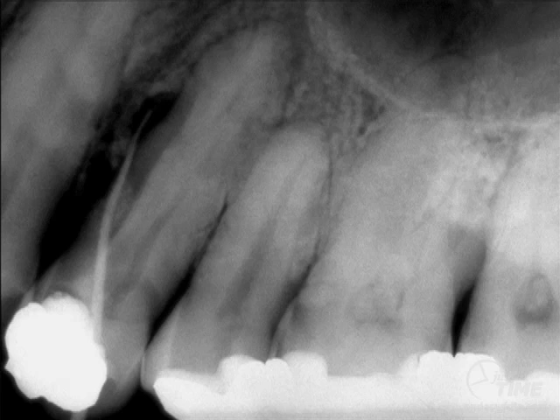So in this particular first bicuspid, there's a large restoration, there's a deep base, and you can again see the rationale for treatment is not only to get the apical lesion, but to get the mesial lateral root lesion as well.